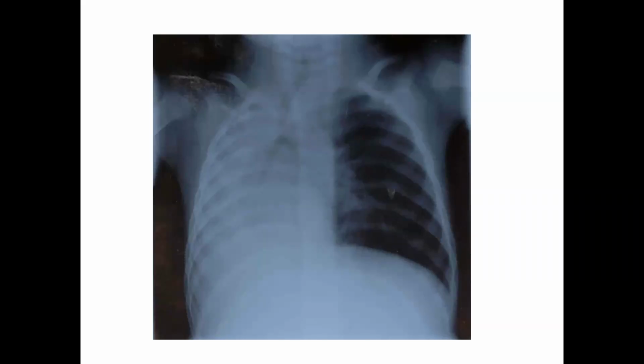All right, so let's go ahead and begin our discussion on some of the radiographic things that you'll be responsible for as a respiratory therapist. One of the first things we'll start with is the different views. Obviously, X-rays are done to help get a look at what's going on internally inside the body.